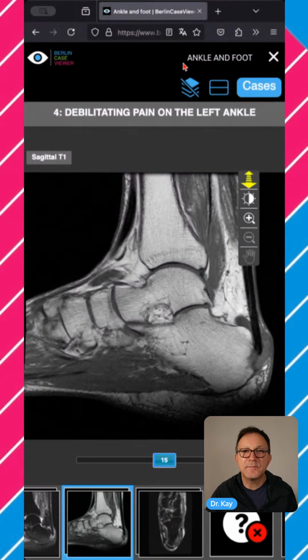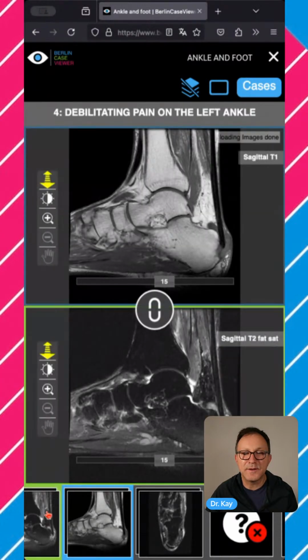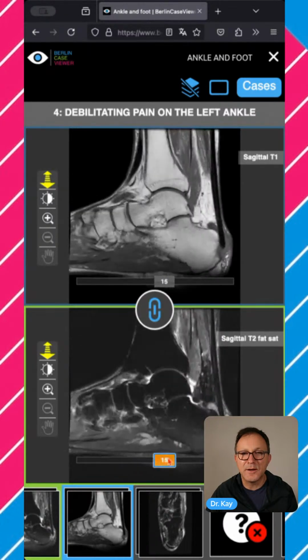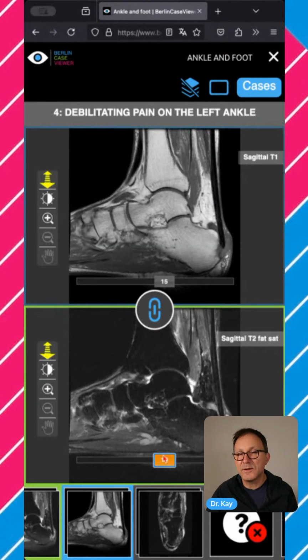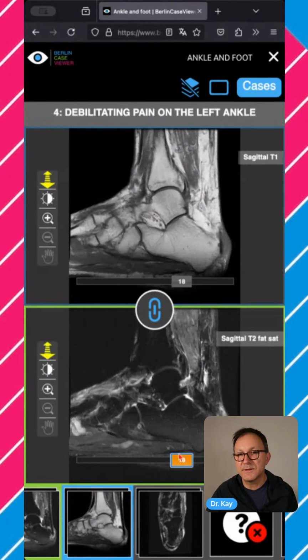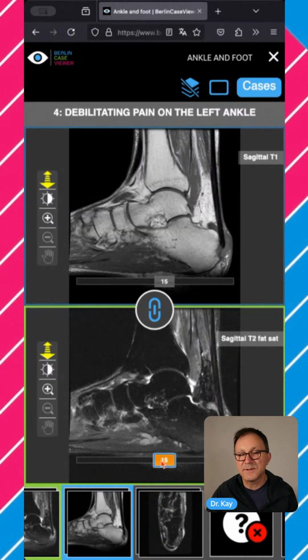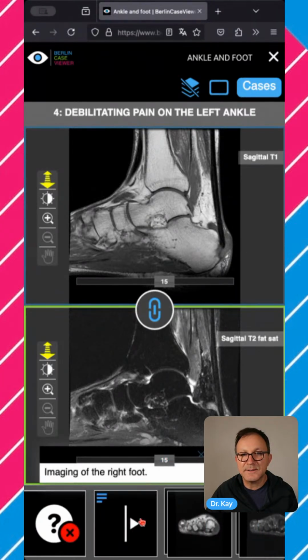And you can even use the split screen, which is the button up here, where you can split the screen, and you have then two viewers together, which you could use to synchronously watch the case. And you should remember, this is all in a web browser. So this is a very well done web app, and it was done by Martin Fischer. Very nice, very nice.